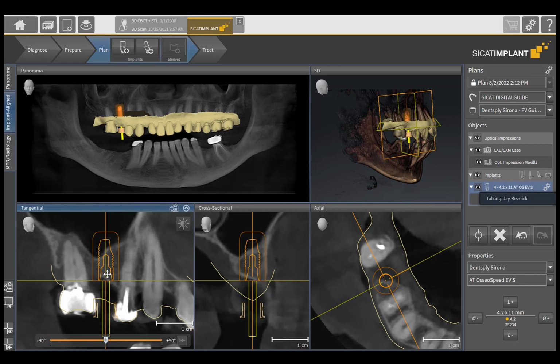Got it. That's usually called a pilot sleeve, am I correct? Or it can be a pilot sleeve, or it can be up to, let's say, the second drill. Okay. So the pilot drill and maybe the first or second drill goes through the sleeve, and then your final diameter you enlarge through freehand drilling. So in a case like this, what I'd prefer to do is trim the adjacent teeth. I'd like to modify the adjacent teeth to give room for the sleeve.